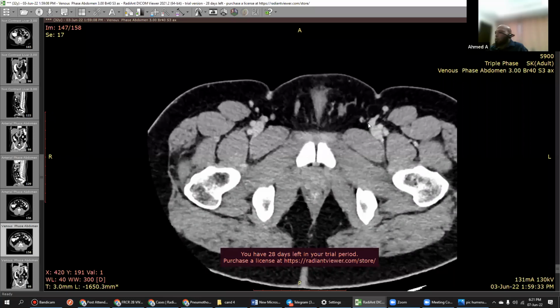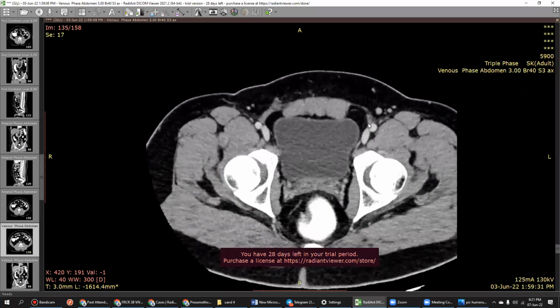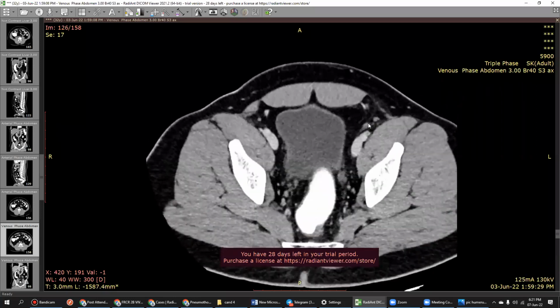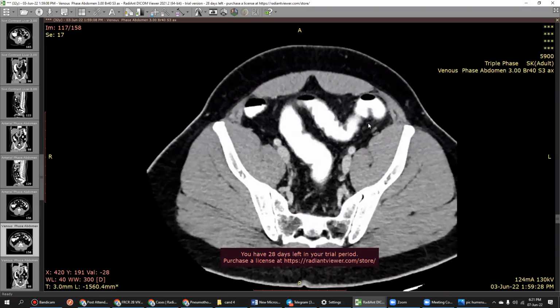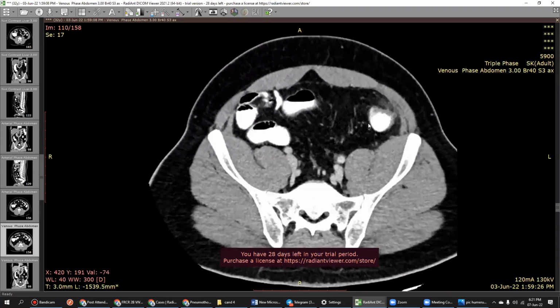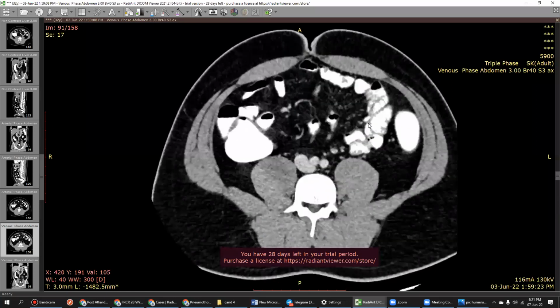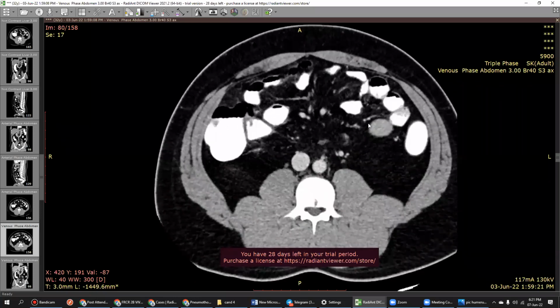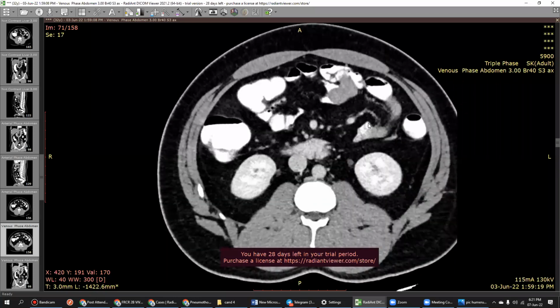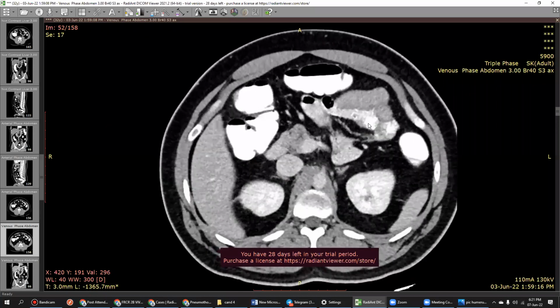Any other differentials you can think of? Other differentials for this would include diverticulitis. However, it is less likely because I couldn't appreciate any diverticula at this region. Omental infarct also would be included in my differential. The distension of the colon is not so good, but in my routine practice, I would correlate with sagittal.